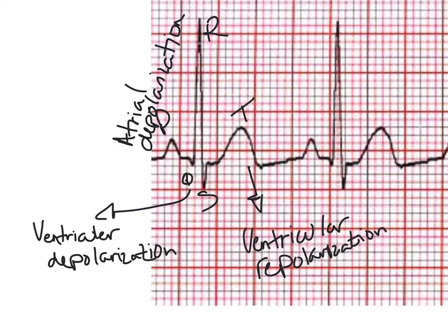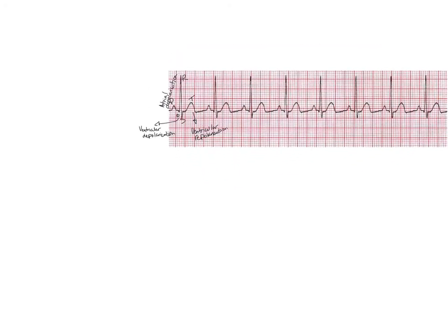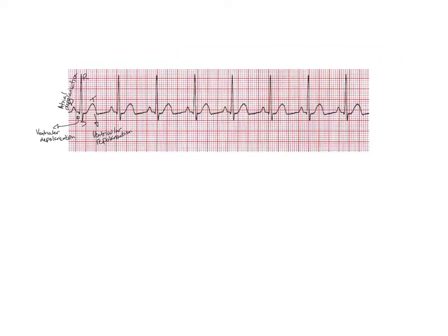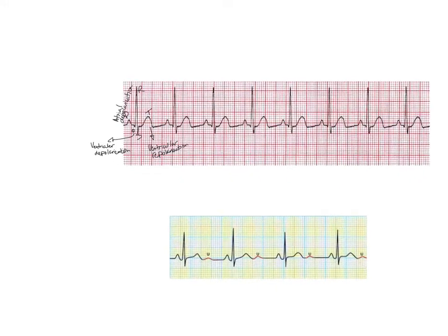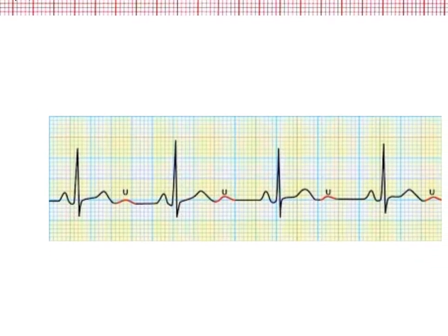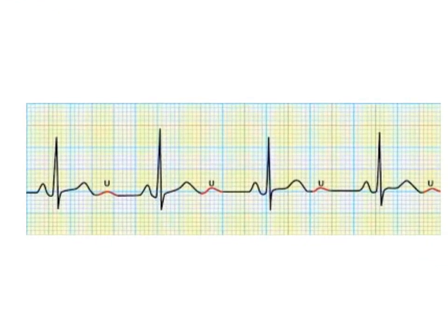I did want to show you guys one more, and I pulled this guy from off the net. Okay, let me see where he's at. He's not there. Okay, there he is. Alright, so sorry, I had to pop him up. Let me go ahead and zoom in. So this is the last wave, okay? This one might be a simulated rhythm, but I just wanted to show you guys, for the sake of the demo, what it looks like. So again, let's go back.